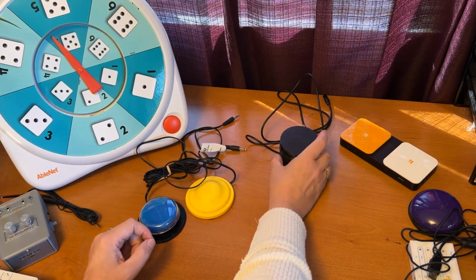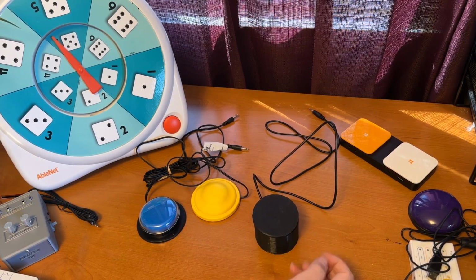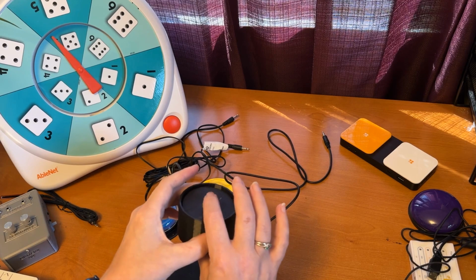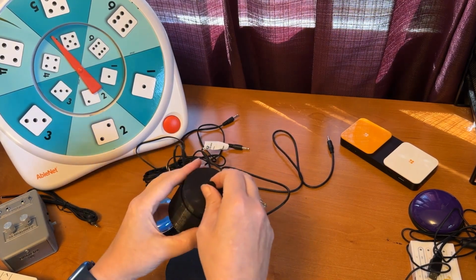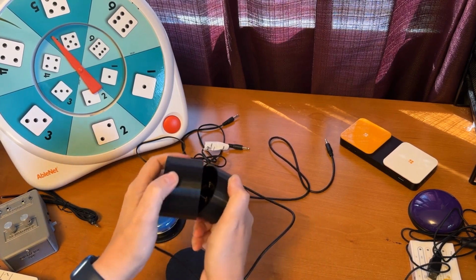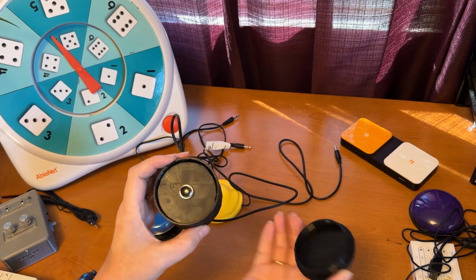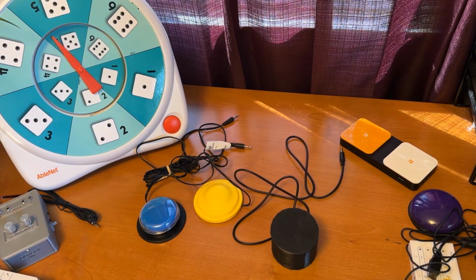Up here, you'll also see a bigger, taller, blockier switch. This is actually a switch that has been 3D printed. So the exterior of this was designed by a 3D printer, and inside is actually just a standard switch that you can get at the hardware store that has been screwed in and soldered from the bottom. You can sort of see in here a little bit. And now when this switch is pressed, it activates whatever this is plugged into. And again, there's just a top that's been 3D printed to activate that way.